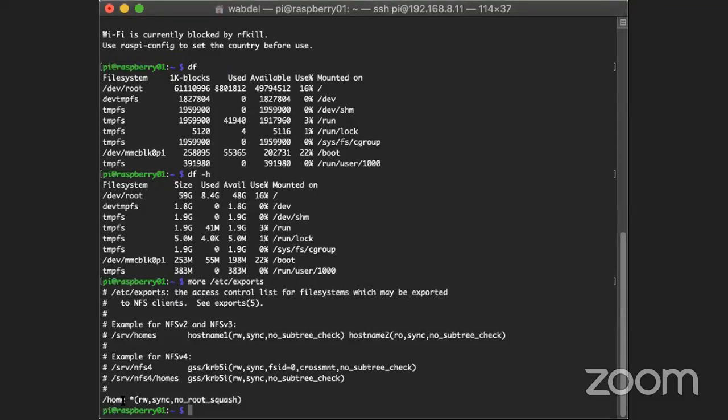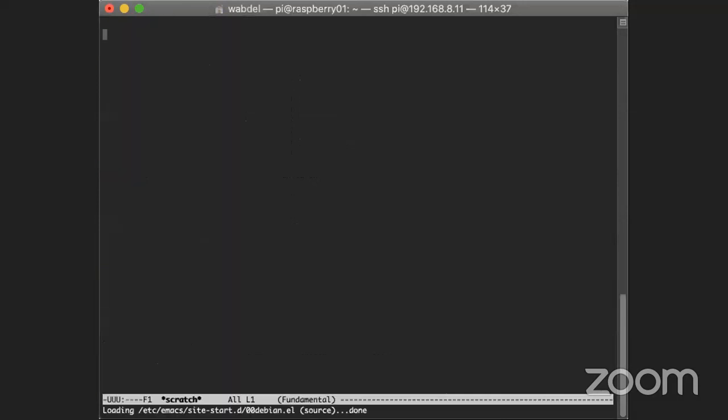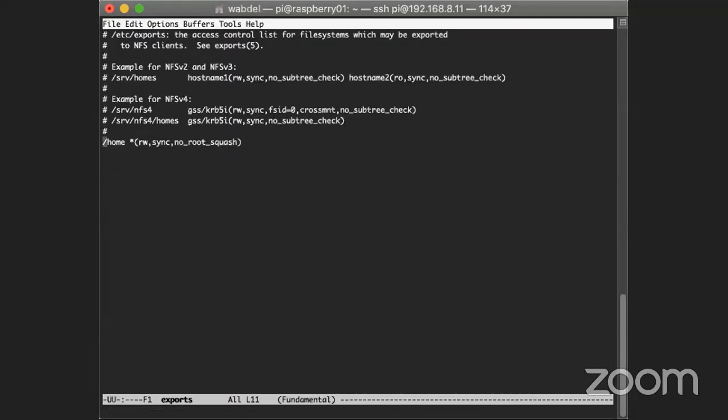So what you need to do is edit this. That is simple. Okay, Emacs. This will be on the server. So instead of exporting the full home directory, you will probably do something like this. Okay, EGS home, and probably you will also need to export the hen house. So you need to export both. You can copy or duplicate this line.